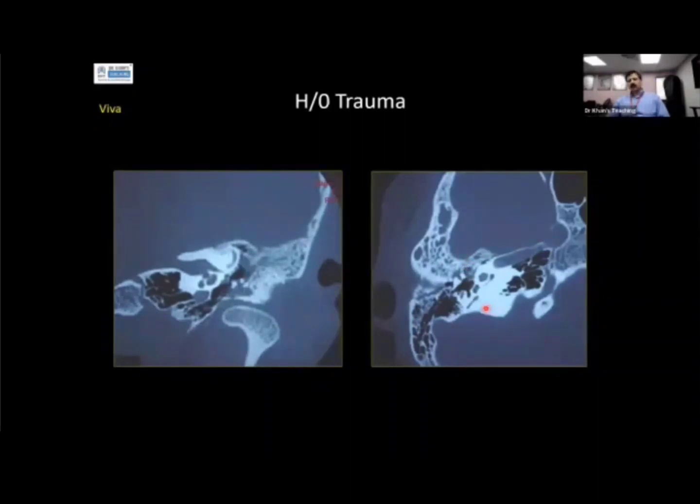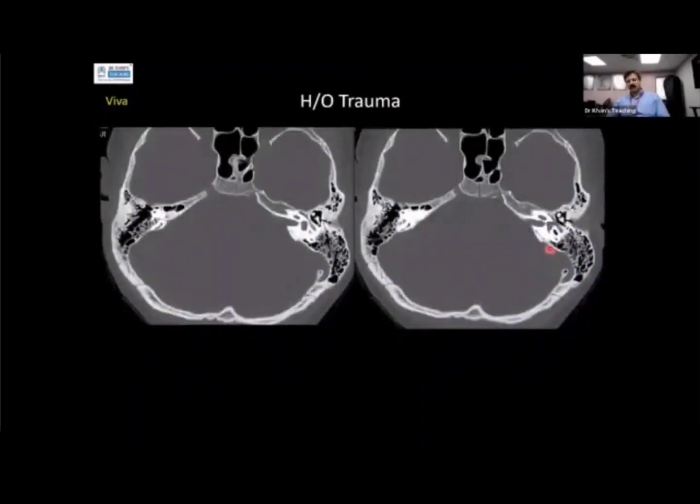So these days, nobody is interested in it; literature will tell you that longitudinal fracture is more likely to involve X type of injuries and Y type of injuries in transverse. But if you ask me, it is all irrelevant. And the main thing for your exam, for your 2B exam, is you have to pick up this thing, incudo-malleolar dislocation. And of course, this is another example where what is happening.